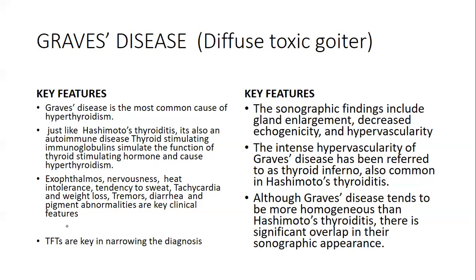Although Graves' disease tends to be more homogeneous. Remember, when you look at the parenchymal appearance in Hashimoto's thyroiditis, I was saying there is a diffuse nodular appearance of the gland.